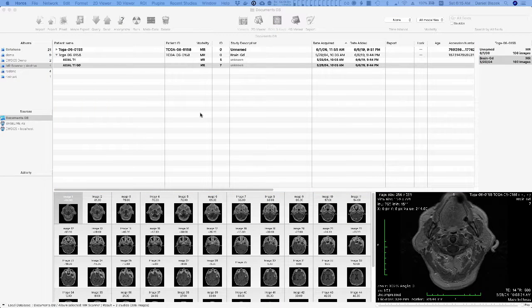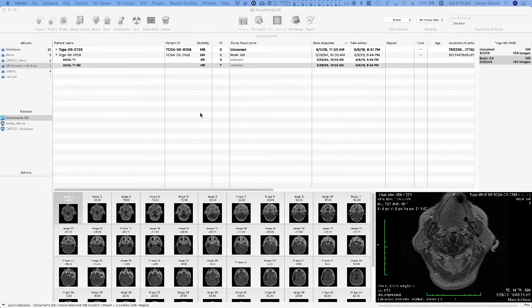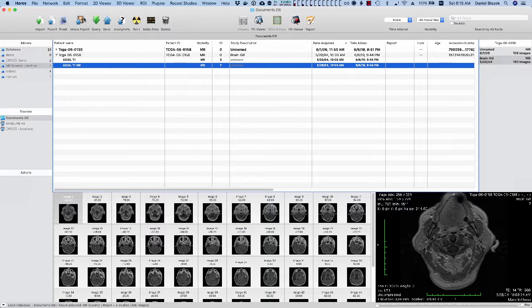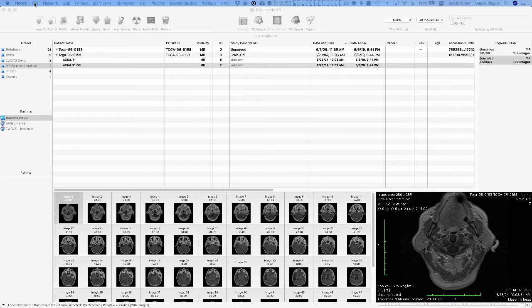When we send a complete MRI head examination consisting of more than just post-contrast T1 series we are interested in, EWOCS will recognize the various types of images based on their DICOM tags. In this case, it recognized the post-contrast T1s, and since no workflow applies to the other images, they will not have anything done with them.